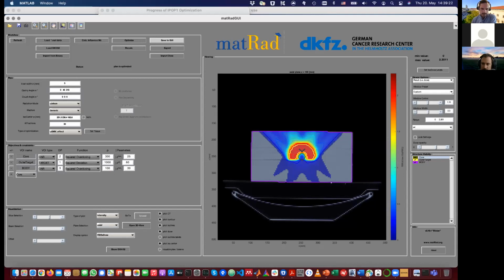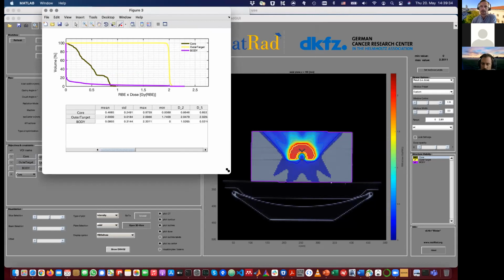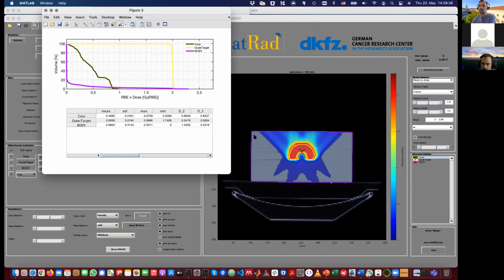which is this. And we can also now have a look at the DVH, which should in principle be even better than the one of protons, at least for the entrance dose, because of carbon ions and their increased effectiveness. The ratio of the dose you give to the entrance to your target becomes enlarged. So there's a better trade-off. You have a larger therapeutic window with carbon ions.